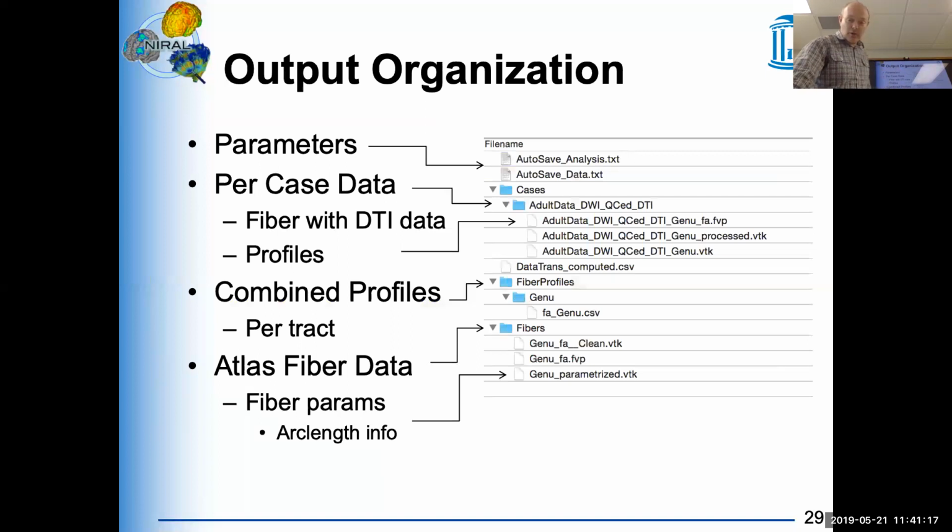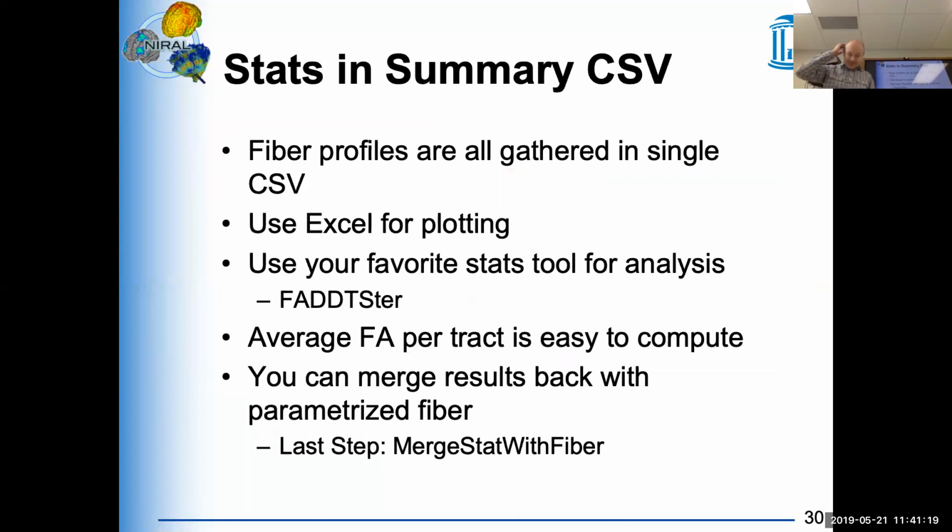Right. So all of these statistics of the profiles, they're gathered into that single CSV file. And that single CSV file with the profile, you can give that now to your biostatistician, or you can analyze that yourself. And that's where the last tool comes in, and that's FADTTSter.